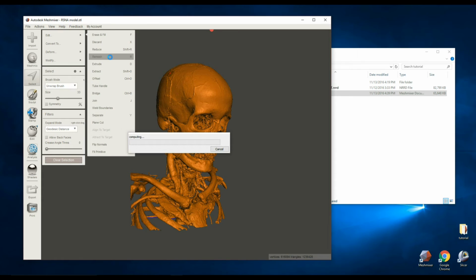Unfortunately, this operation takes a pretty long time. On my computer, and I have an 8-core PC with 16 gigs of RAM, it takes about 6 or 7 minutes at least. So we're in for a little bit of a wait while it's doing this. But we can go ahead and check on the file that we uploaded to the Embodied website in the meantime.